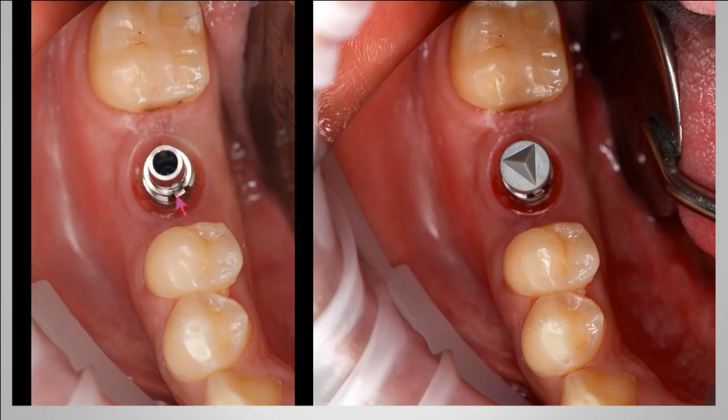If we place this notch on the facial, then we run the risk of having our sprue on a contact point, which makes for more complex adjustments during the seating of the restoration.